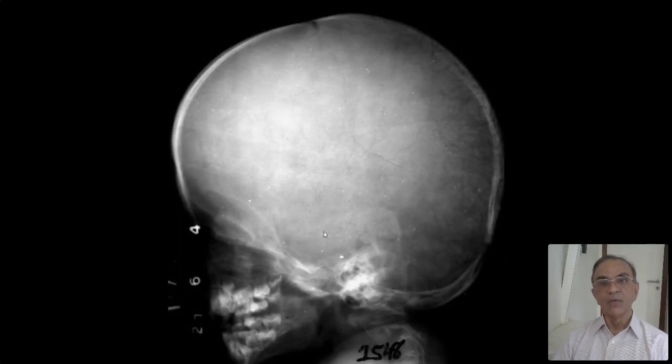Okay, Wormian bones in osteogenesis imperfecta. They are also called sutural bones. You see multiple small bones. Homework. Why are they called Wormian bones? So I'm giving you lots of homework. But the most important of all these homework is bumpy bones. So this is OI, thin skull wall, looks black. You often get open fontanelles, not always, but you get multiple Wormian bones. Multiple bones within sutures, and this is classical of osteogenesis imperfecta.